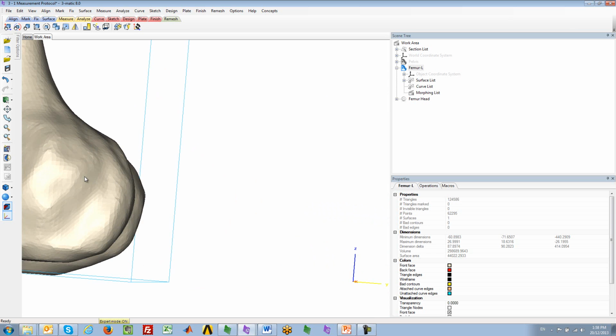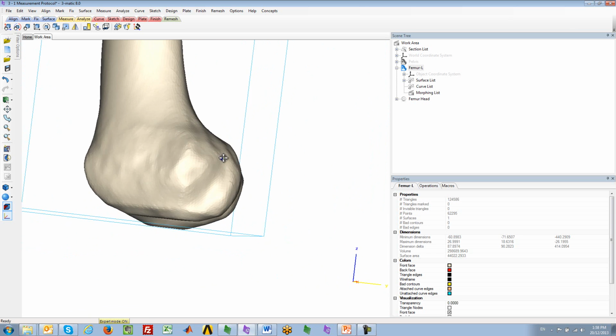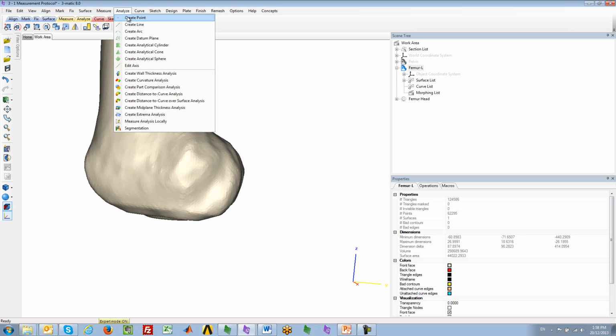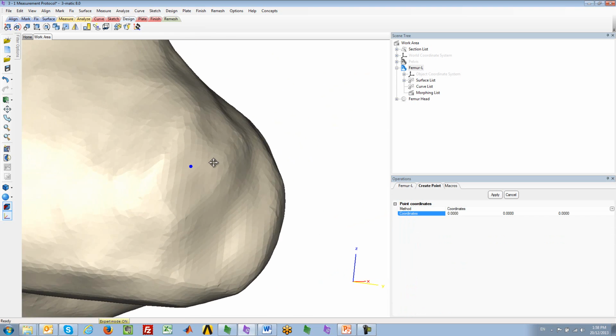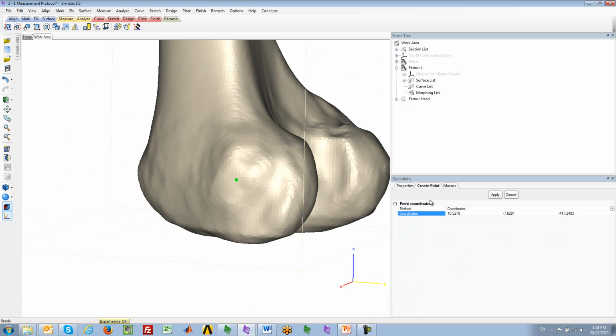You can see it as a landmark on the femur, and using that you can mark. Keep in mind that if you're comfortable using Mimics, you can also do these on the medical images in Mimics and bring it into Trimatic. So over here you can see this joint. There's an anatomical feature over here, and we're going to mark it on the center of that anatomical feature.